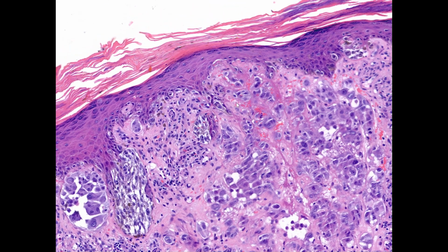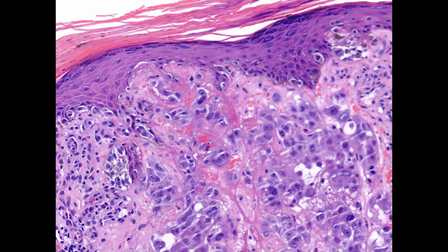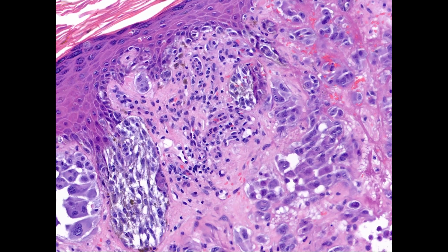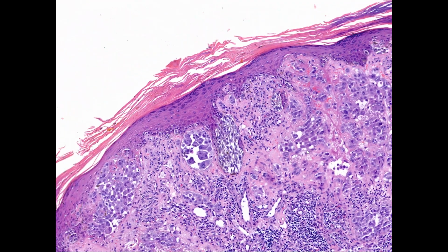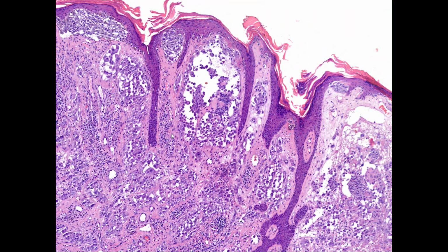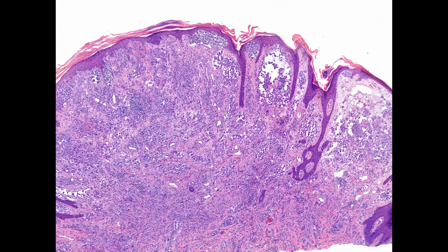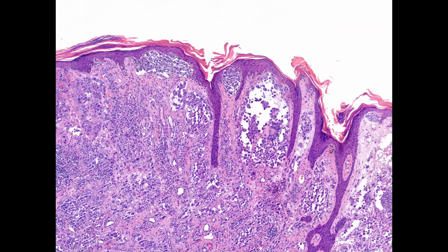And then additionally, we're seeing kamino material in the perijunctional zone. Sometimes it's formed into bodies. Sometimes it's a little bit more globular and papillary dermal. And then lastly, we're seeing fascicular morphology. We're seeing bundles of cells that are often fusiform, could be epithelioid, that are longer than we are broad. And so that combination of fascicular morphology, kamino material, large melanocytes, acanthosis, those are the morphologic clues that take us to the diagnosis of Spitz lineage.